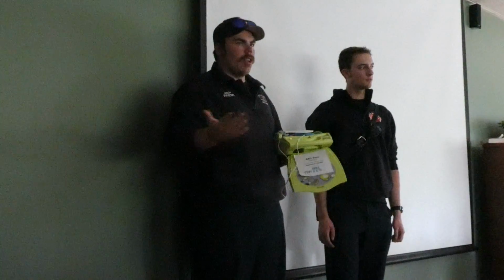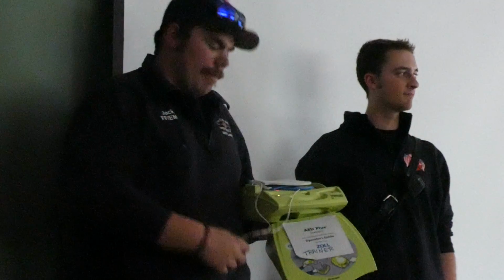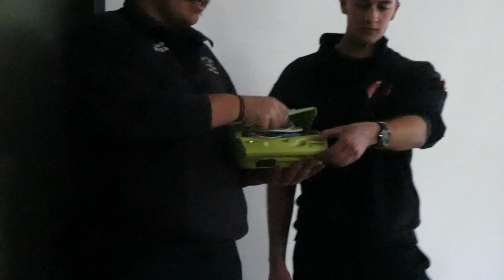You're going to turn it on, and it's going to tell you stay calm, call for help. If they're unconscious, throw them on. Like I said, it's not going to shock them if they don't need to be shocked. If they just got excited because the lights went out and passed out, throw them on. It's not going to hurt them. It's better to have them on and not need them than go, I don't need it, I think they might have a pulse.